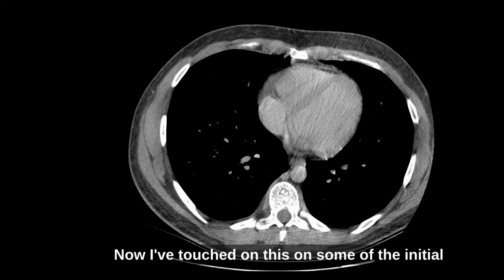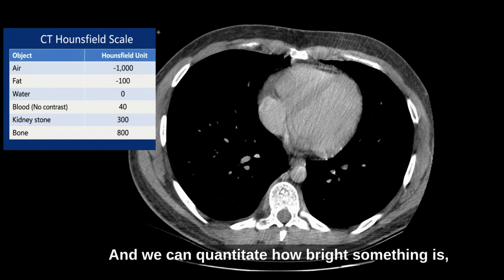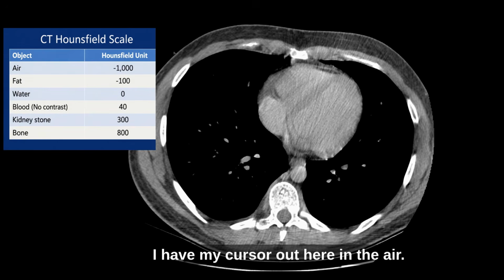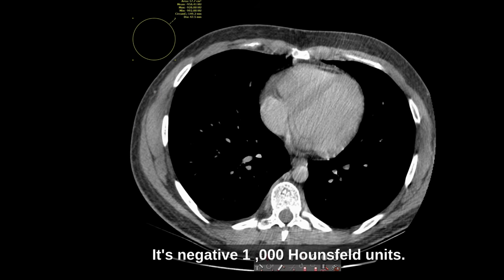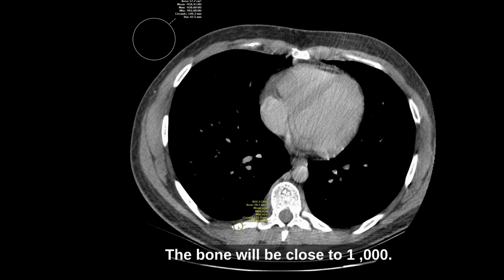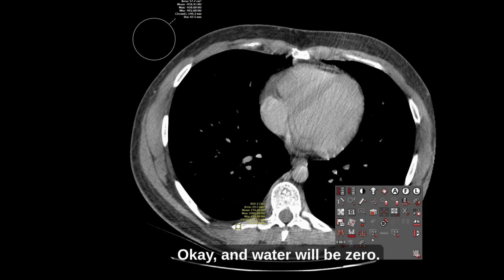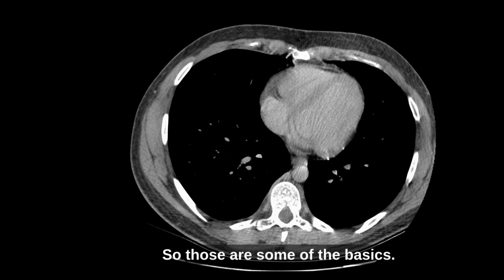Now, I've touched on Hounsfield units in some of the initial podcasts and videos. The x-ray beams are going around the patient 360 degrees and hitting the detector, and we can quantitate how bright or dark something is using Hounsfield units. Hopefully you can see this. I have my cursor out here in the air. It is negative 1,000 Hounsfield units. The bone will be close to 1,000. Water will be 0. Fat, and this patient doesn't have much fat, will be negative 100. So those are some of the basics.